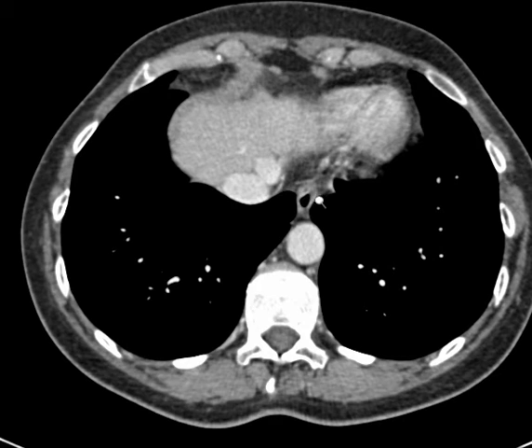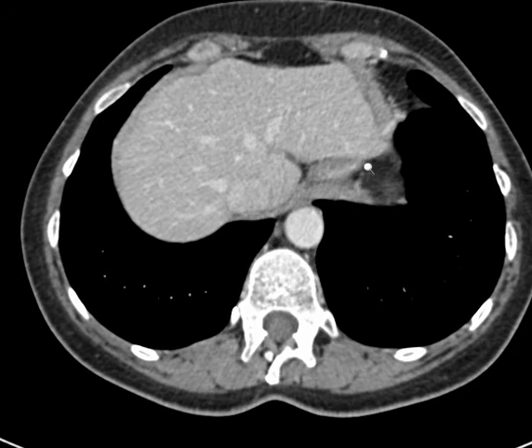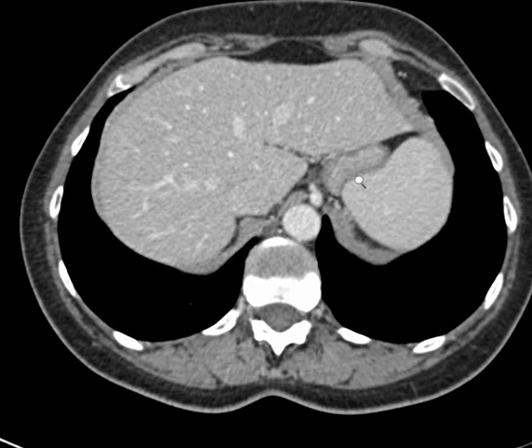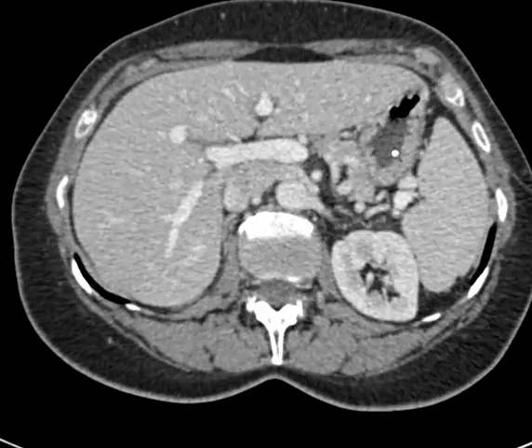So here we can see the esophagus as we head inferiorly has a little bit of gas in it. And continue inferiorly. And now we're about to get into the stomach. So again, here's the esophagus. This is liver over here, just for reference. Again, the aorta, and we're seeing some of the diaphragm slip over here. This is the spleen, but we're going to focus now on the stomach. So the esophagus is now joined up with the stomach. And as we head inferiorly, we continue to see the stomach with a little bit of liquid in it.